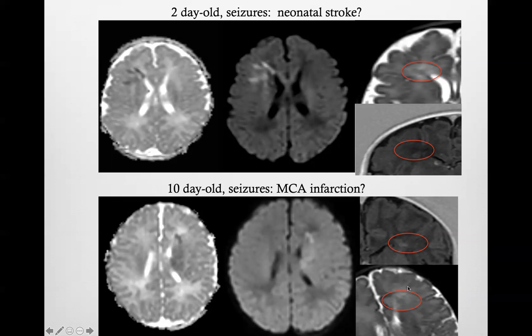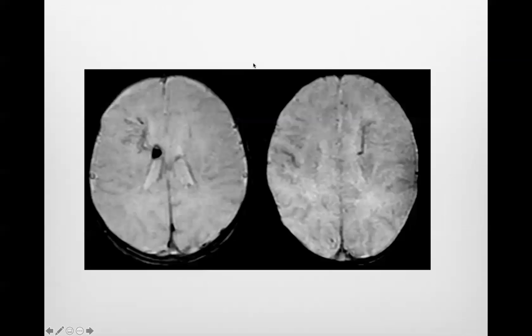What is that? Well, we can see also in T2, believe me, this is a T2 and T1. So T2, T2, T1, T1. These areas slightly bright in T1, slightly dark in T2. These are very small areas of ischemia along this structure that are called deep medullary veins, they go from the cortex to the ventricle. So this is actually also important in these cases to look at the gradient. Again, the gradient sequence is the sequence sensitive to blood. Look, we see that these veins are engorged and full of blood with some hemorrhagic periventricular changes as well in this patient. So what are those?